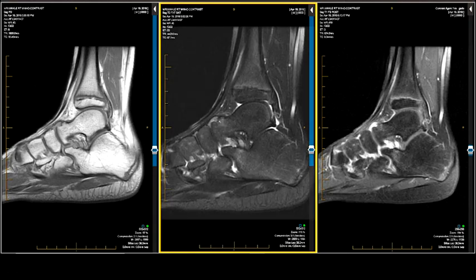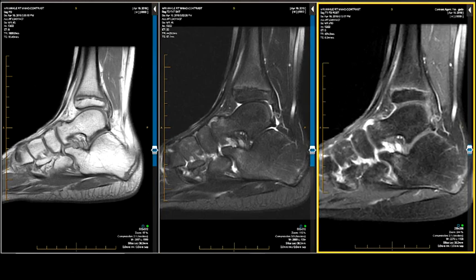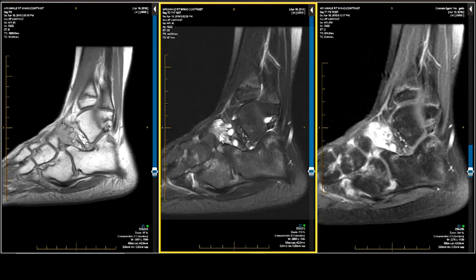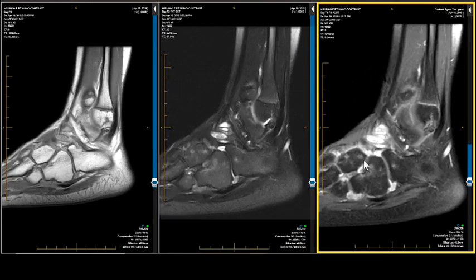We have peripheral subcortical edema again, and also spotty edema, but this time we've got synovitis. That's pannus. That's not simple fluid on this T2 weighted image. That's all pannus in the stem ligament bursa or frondiform ligament bursa arising from the subtalar space.